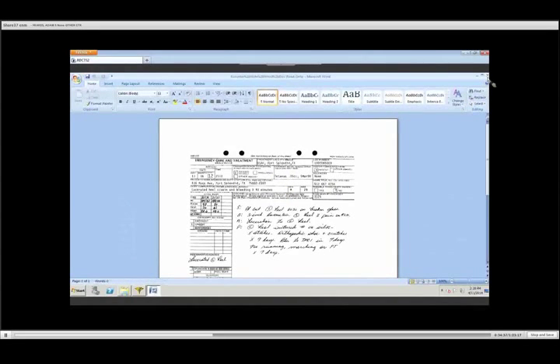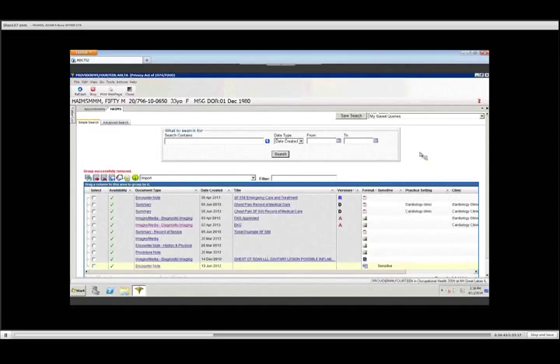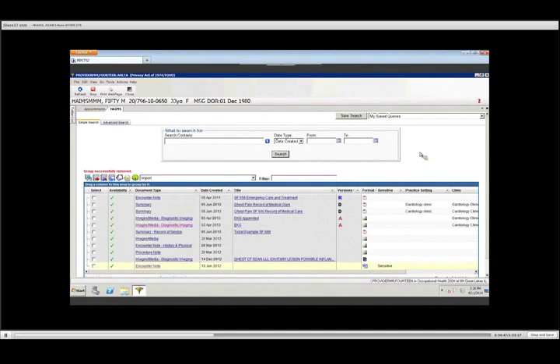Sir, I got another question. Yes, sir. I noticed that that is a Word document, so when you open it, could I make alterations to that document right there, and it would be saved? Another great question. Student wants to know, do you have the ability, when you are in HAIMS, to open up documents or assets and make changes to them and simply click Save and you've changed the asset?